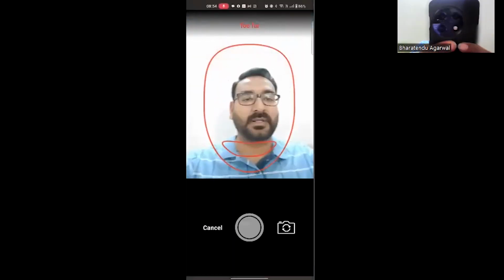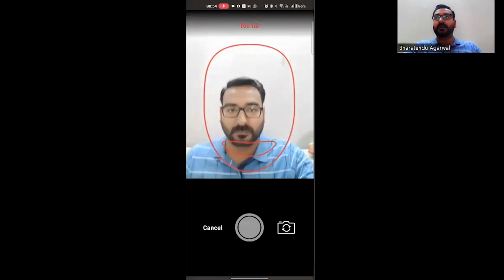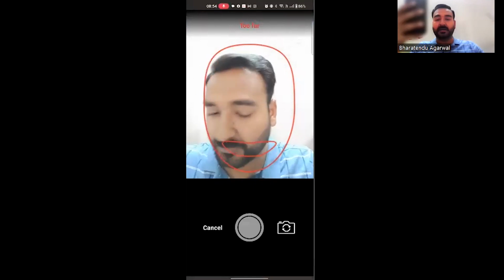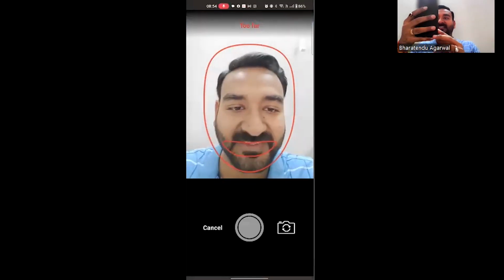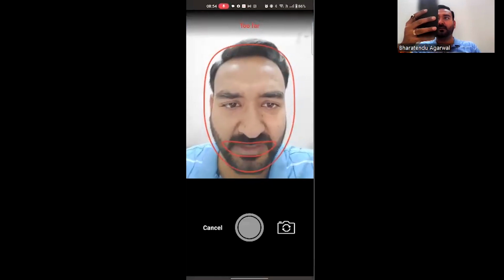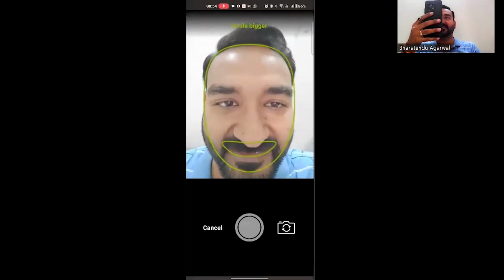So it's saying to place my face right here. Maybe I should take my spectacles off for this. Why is it saying too far? Okay.